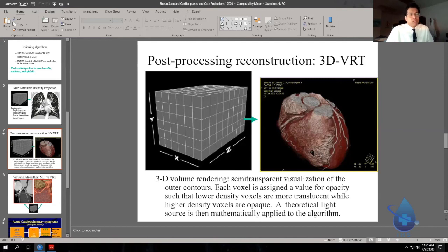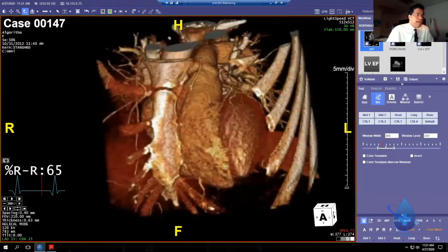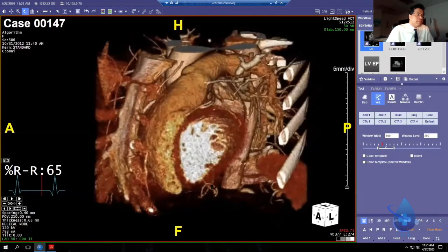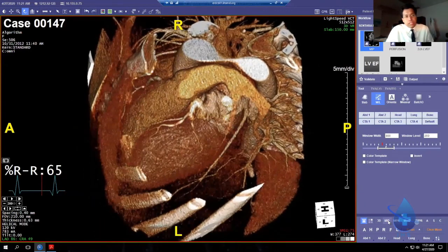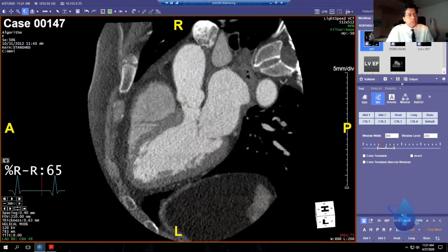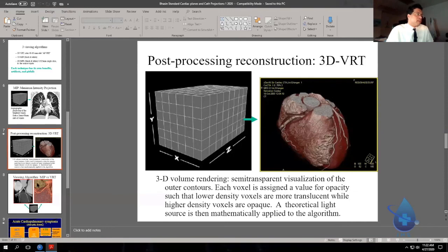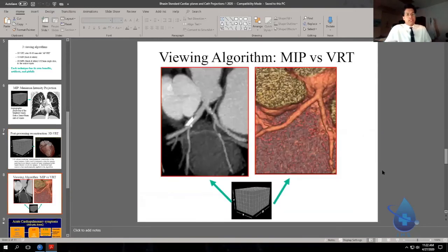The bottom line is, don't trust color. We only use color to move in space by clicking that 3D button here, back and forth. Find the right camera angle, and then you switch to MIPs and MPRs to make the diagnosis. So you make your diagnosis in black and white. Let me illustrate the point and drill it home, because you guys are not going to believe me, and you're going to make some mistakes, and I can't let those mistakes be dangerous ones.